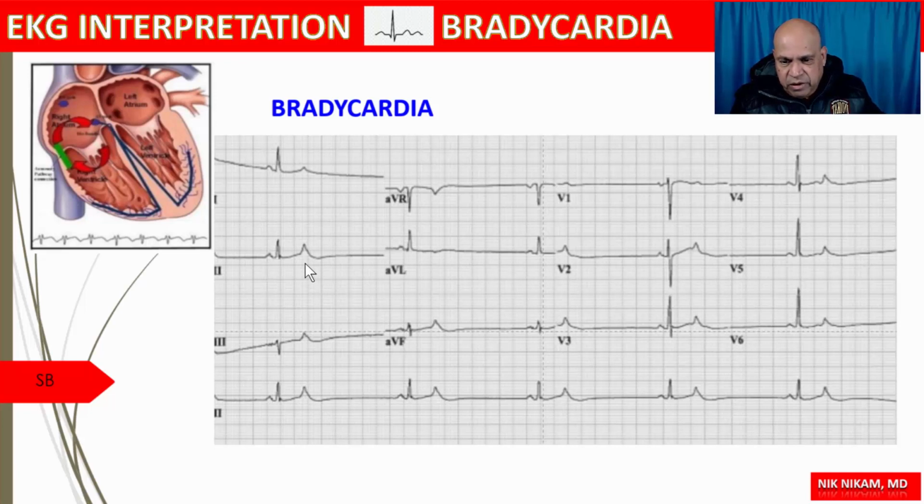If you pay particular attention to the T waves, they kind of look funny. As you can see, here you can see a little notch, and then we see the P wave. So whenever we see something like this, we should always keep in the back of our mind, are we dealing with a sinus rhythm with blocked PACs creating atrial bigeminy, which resembles severe bradycardia. Sometimes it may not be easy to determine that this is atrial bigeminy.